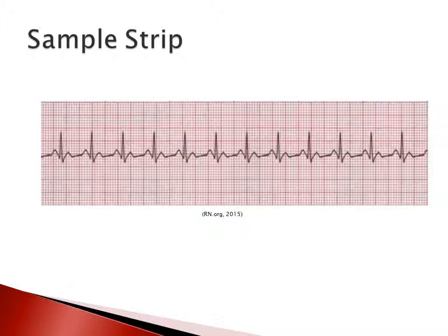And the normal range for our PR interval is between 0.12 to 0.20 seconds. And this one takes up 3.5 small boxes, making it 0.14 seconds. The QRS interval is 0.06 seconds because it takes up 1.5 small boxes. We know that this is normal. And there are T waves present without peaks and without any inversions all the way across the strip.